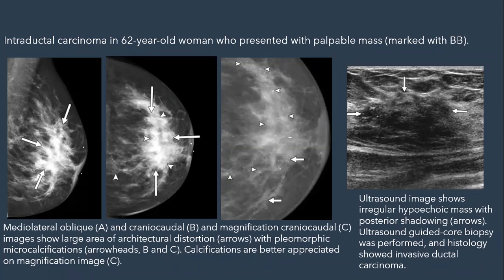See, the microcalcification is definitely better appreciated on spot magnification, and look at the ultrasound, which demonstrates an indistinct, irregular, heterogeneous hypoechoic mass with posterior shadowing, and the guided biopsy revealed invasive ductal carcinoma. Okay.